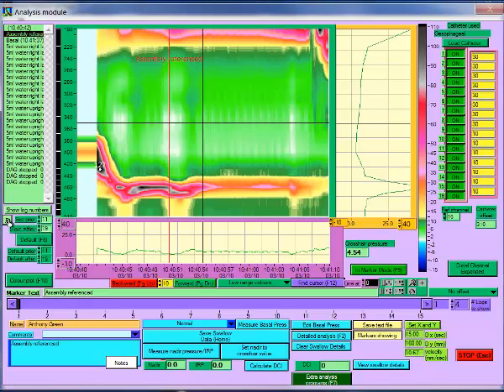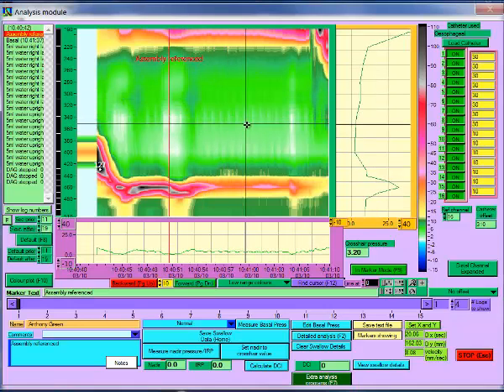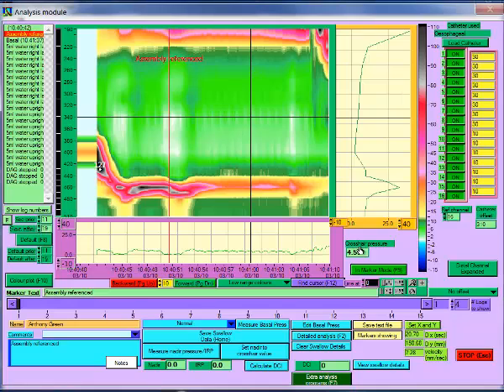The graph displayed is a colour plot of the manometric data at the selected point in the file. Markers are illustrated as a vertical red cursor with the text of the marker on the cursor. The black crosshair cursor can be moved around to interrogate the data. As you move the crosshair cursor, the pressure at the junction of the crosshairs is displayed under crosshair pressure.